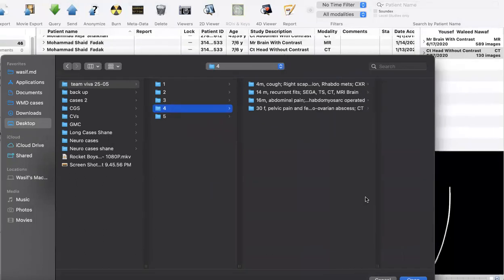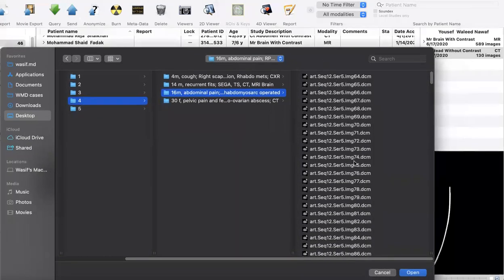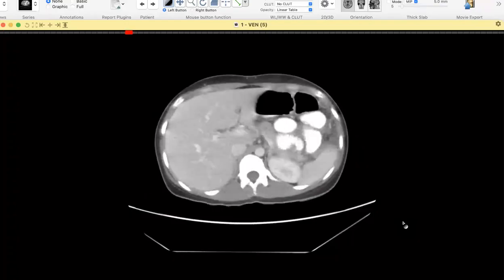So even our first line was thought was like you, Dr. Sami, we gave the same differentials, but once we got that on the CT, we went for tuberous sclerosis. This was a straightforward case.